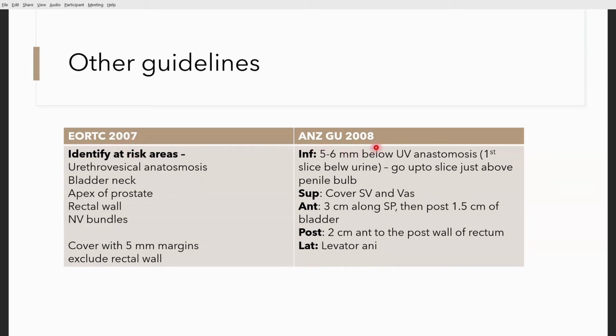So let us quickly take a look at a post-operative case. I'm going to throw a challenge at you. I'm going to magnify this, and I'm going to scroll through.